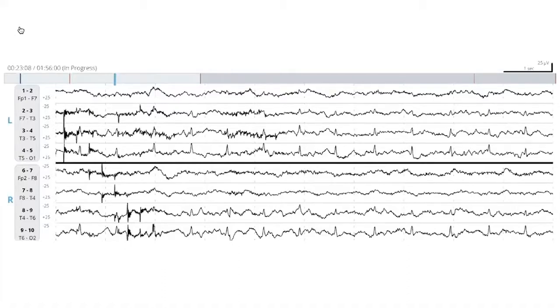So if this happens, I second guess it because of that high consistency. If you're recording this and you're seeing this on the portal, you may want to call the nurse at the bedside and say, hey, can you register the pulse at that given moment? And then you will see if it coincides with the frequency of this artifact.